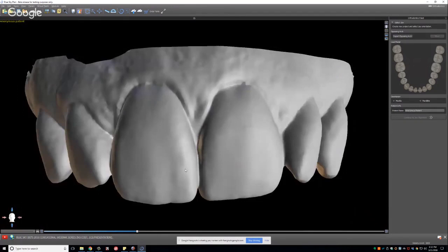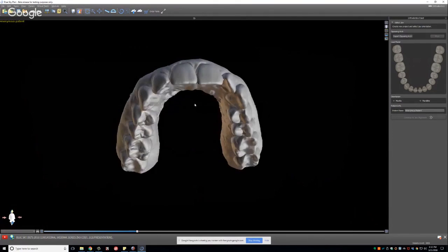Okay, I do want to make sure you know that I can't remember if it's in the old version. It wasn't. No, actually, sorry, I do remember that. In the previous webinar, the opposing arch was not integrated directly within the software. So as you're moving along, you really want to focus on walking through each one of these steps.